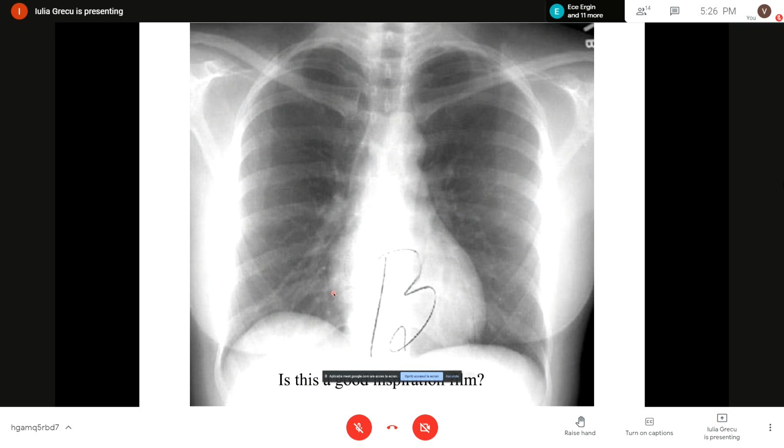So I can safely say that this was a correct chest X-ray. And for the anterior, I go again from up. This is the first one. 1, 2, 3, 4, 5, and 6. And here the 6th arch will meet the diaphragm in the middle of the diaphragm.